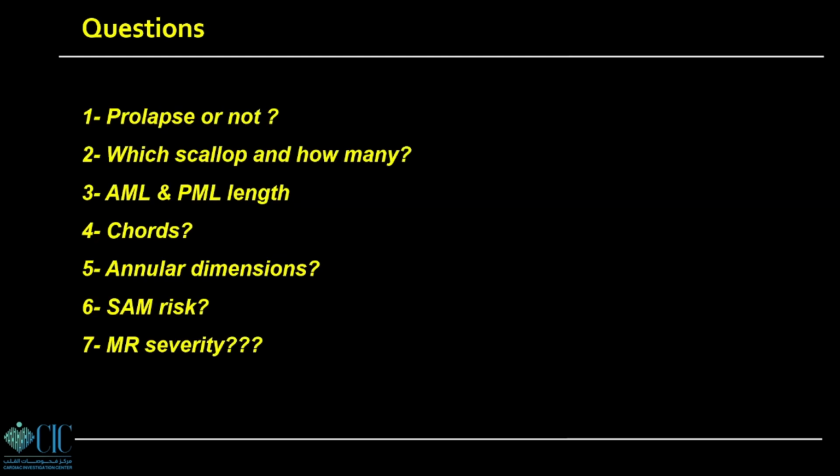Whenever we say mitral valve prolapse, we usually think about mitral repair, not replacement. This is the standard of care in specialized centers. So first of all, we need to identify whether it is prolapse or not. Second thing, which scallop and how many scallops. It is not accepted now, with this advancement in imaging, to say this patient has mitral valve prolapse and that's it. We have to specify which leaflet, which scallop.